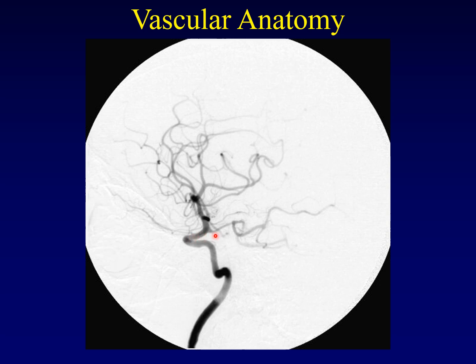And the answer is that we've lost that beautiful view of the middle and anterior cerebral arteries and the internal carotid bifurcation. It's all lost in the tangle of vessels, whereas it was splayed out so clearly for us on that previous image. I sometimes get asked, what's going on right here?